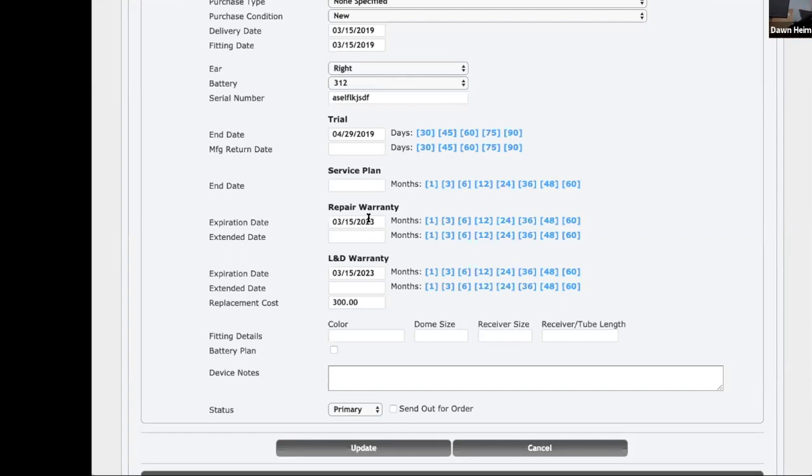And if you get a bonus extra few weeks or months for their warranties, then it's a bonus. Because there's some companies, like Starkey will give you an extra like 2 to 3 weeks, whereas Phonak gives you 3 months, you know? And I can't bank on that. So I'm just gonna do it based on the day of the fitting.